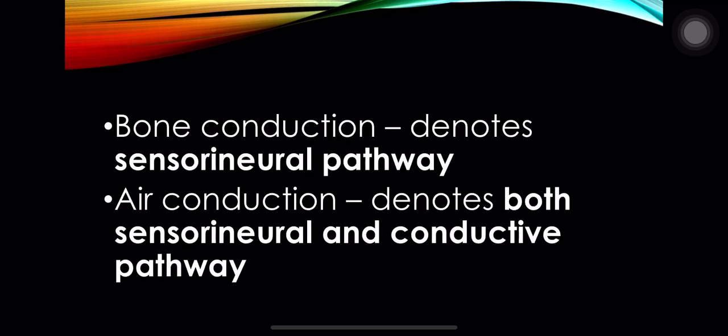One important thing one should know is bone conduction and air conduction, what it denotes. So bone conduction denotes the sensorineural pathway, whereas the air conduction denotes both sensorineural and conductive pathway.